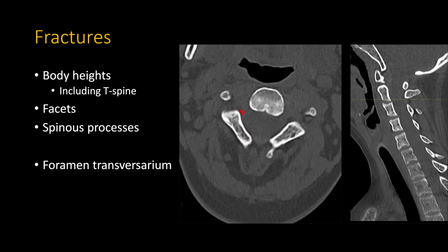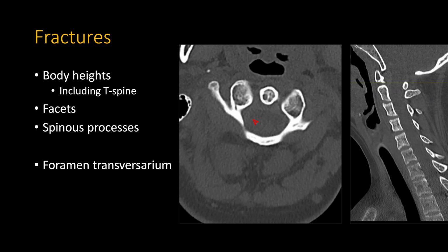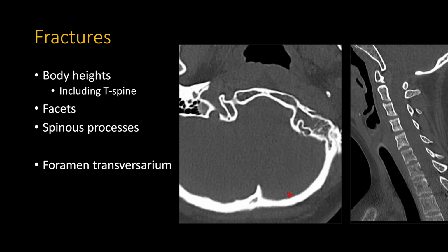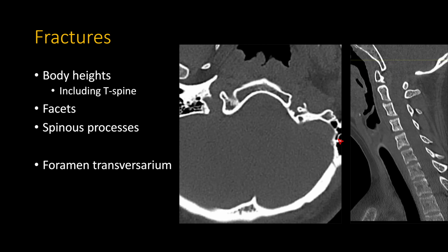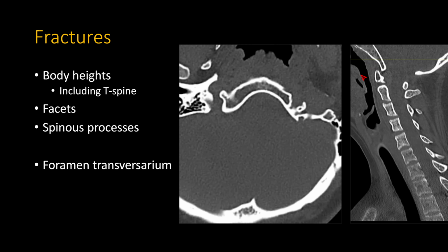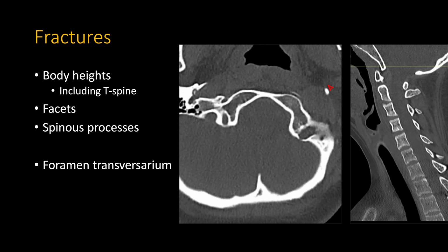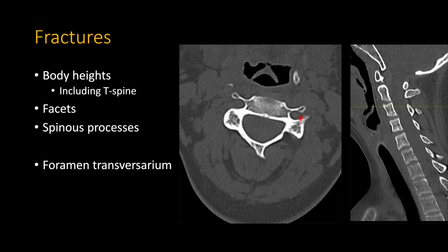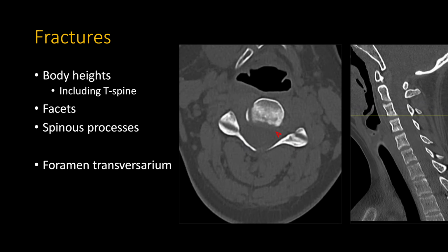Now, obviously, you go through all your cervical spine levels, but there are other bones that get included. You have some parts of the calvarium included. You usually get a little bit of the mastoids. This one you don't get so much, but the temporomandibular joints you get. So make sure those are intact. Again, it depends a lot on your institution and how much they reconstruct.